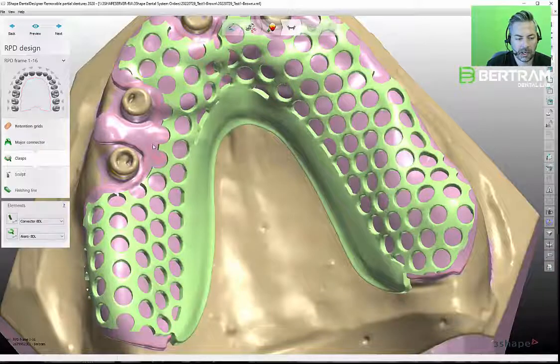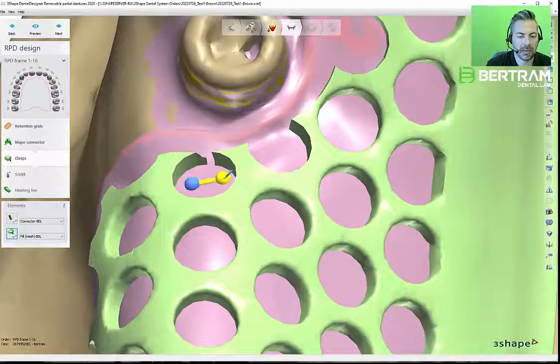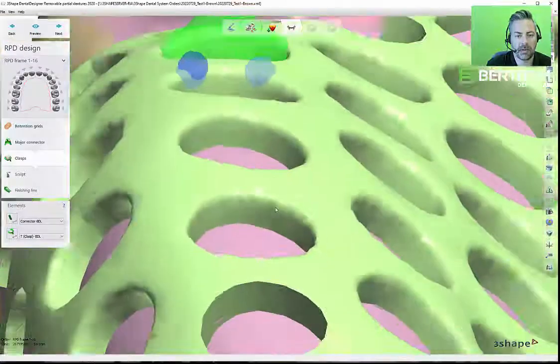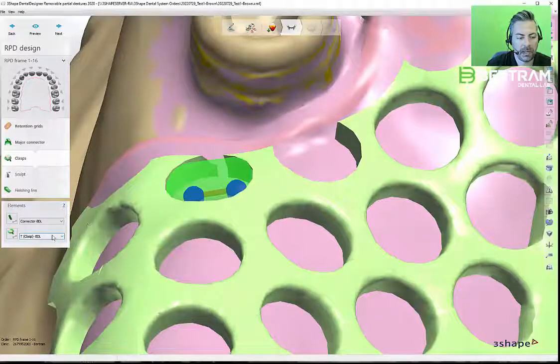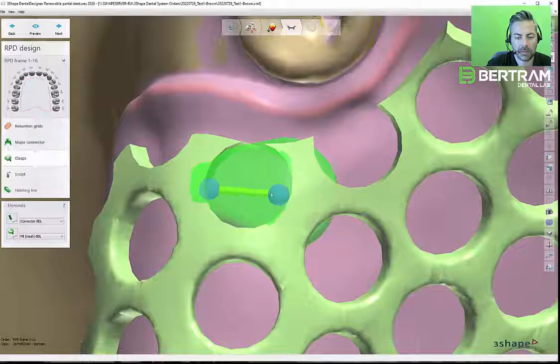So we're going to clasp being. Obviously there's no clasp, but what we're going to do is select from our library of parts here our fill mesh. And one thing about the fill library, again, is that this part behind the scenes is vertically set to the same thickness as the mesh. If you just take a clasp, like let's just say we grab a T-bar or T-clasp, yeah, it'll fill it, it works, but it's not vertically the same height. So then you end up spending time bringing it down or smoothing it. So if you use the fill piece for mesh that we have in the library already, it's much easier.